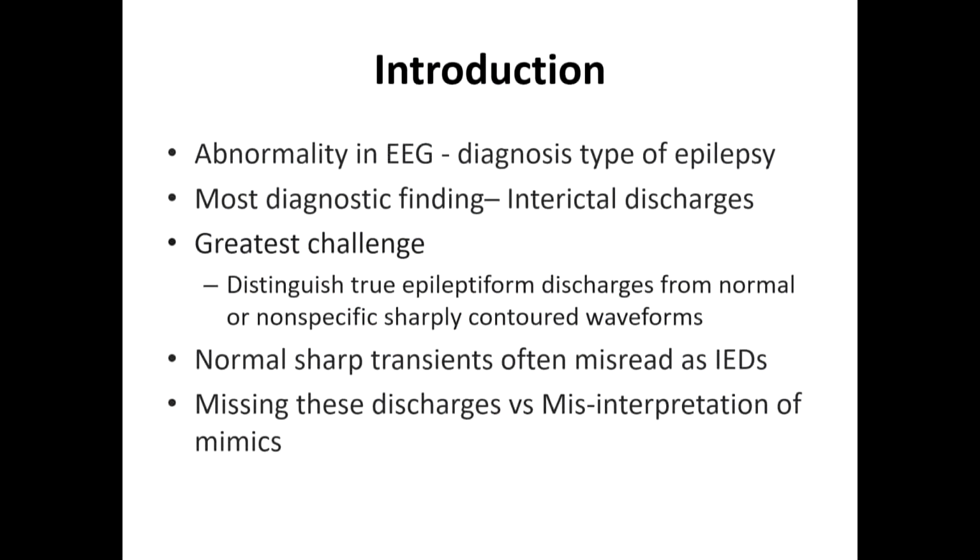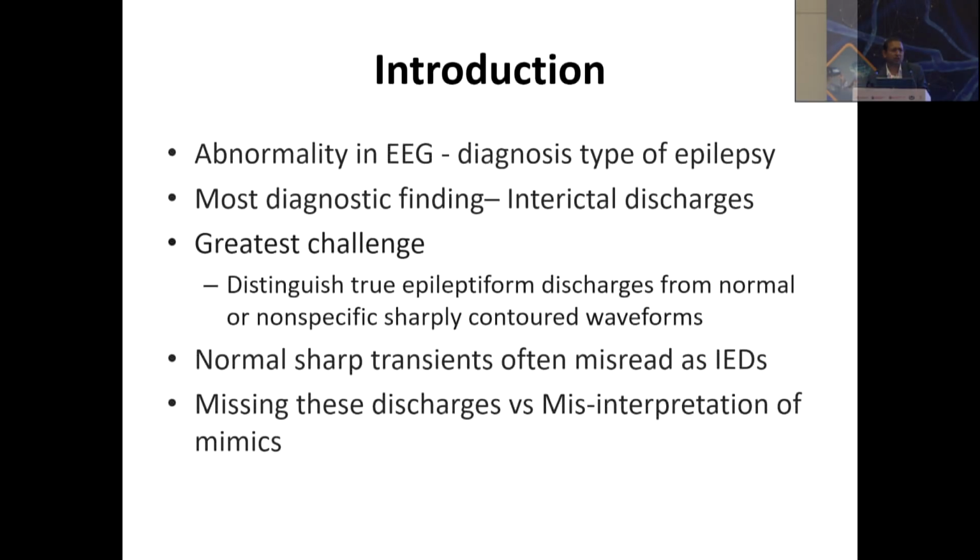Yeah. So, very important to know, one is what is the normal finding, then what are the artifacts, and then third, what are the abnormalities which look like spikes. So, my topic is to cover those abnormalities which look like spikes.